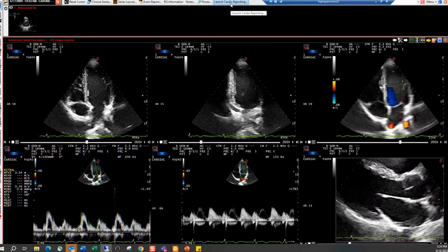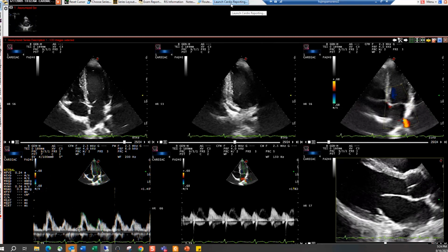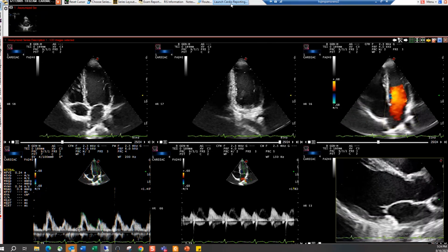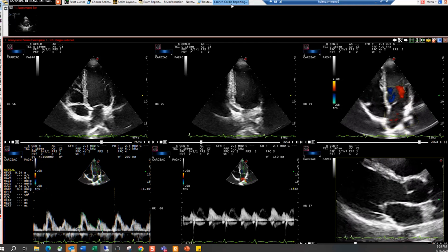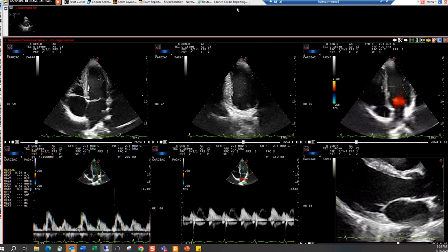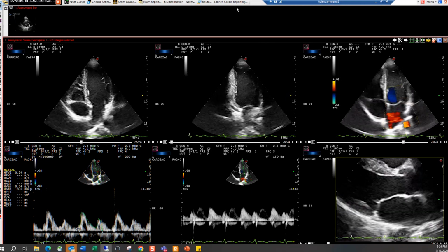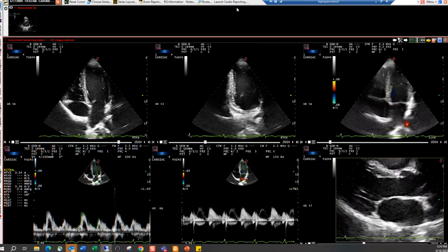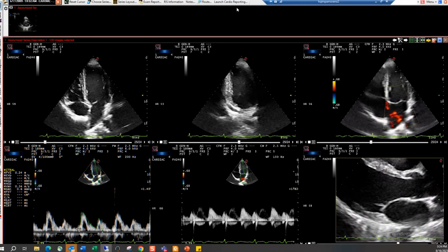That's correct. And because we're two different people in two different places, we'll be doing it in a different way. But when the user sits down, they click that tool, and the report engine just pops up on the next screen. And because it has the full PACS capability, if you want you can do it on a single screen. You can do it on 2 screens, which is ideal. You can even do it on 3 with imaging on 2 of the screens and the report engine on the 3rd. It doesn't matter. However you want to organize it, that's fine.